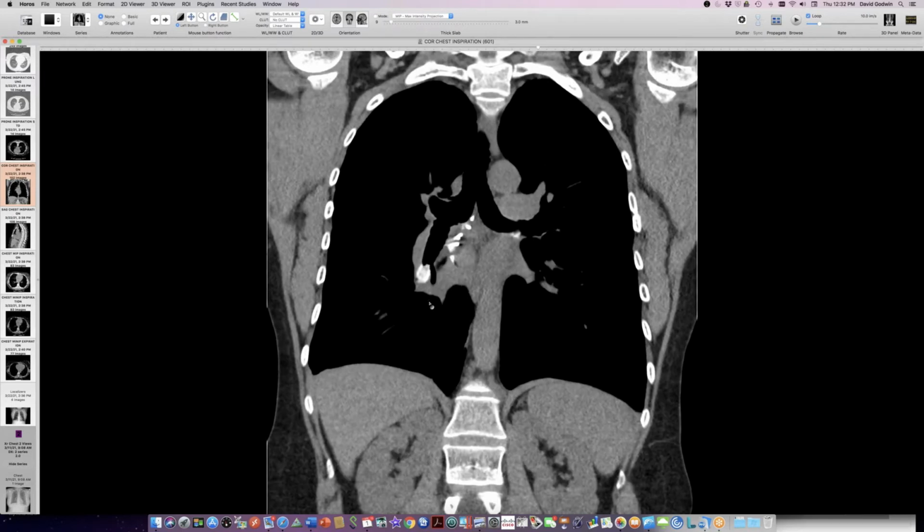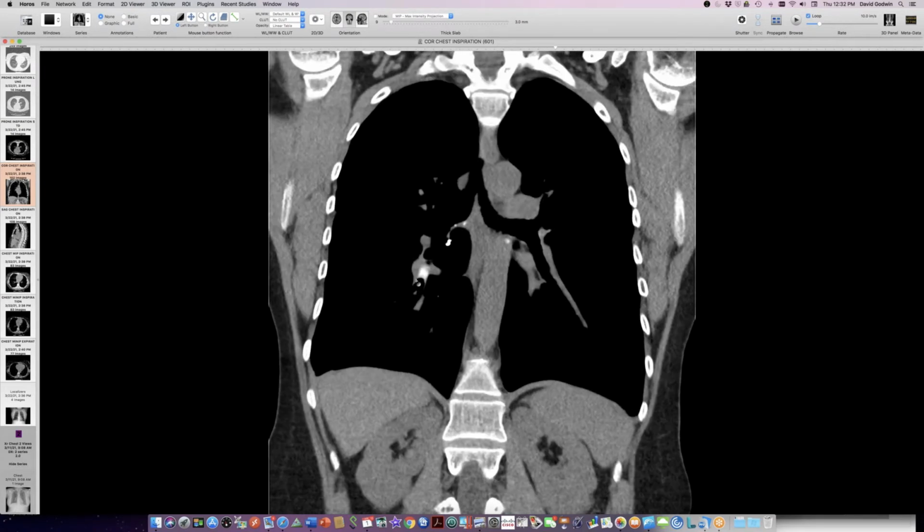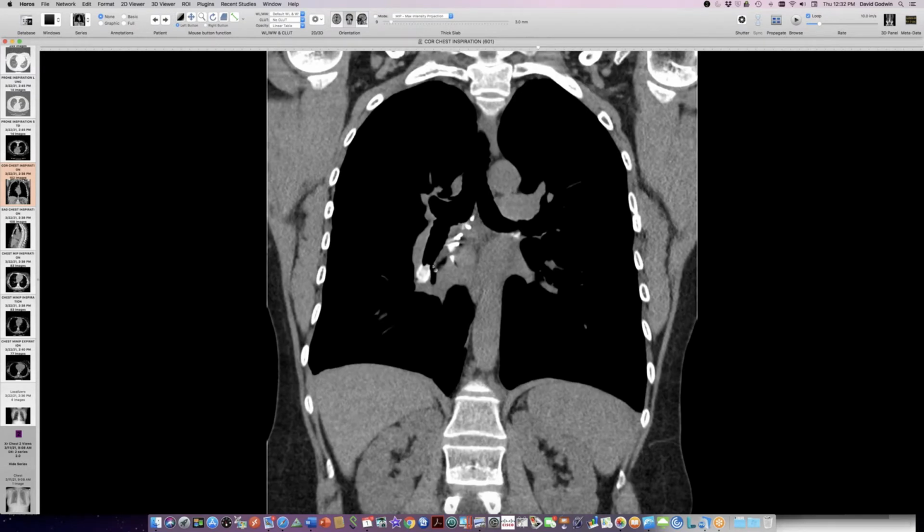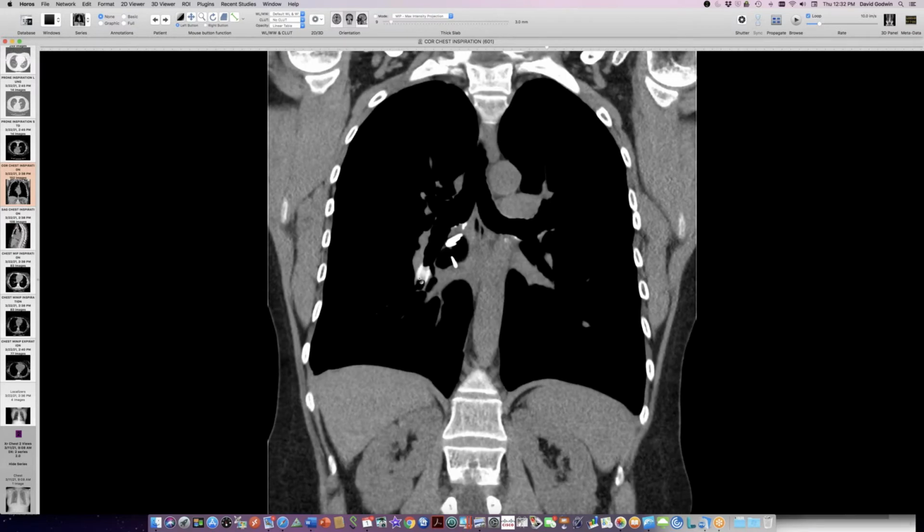So she takes calcium citrate, and she also takes a magnesium tablet. So it's thought that one of these tablets got aspirated, and we have this very bright object. She had been on iron, but iron was actually discontinued. That was in the past. And if this were really iron, it would be even denser than this, and the iron component would be in the center rather than on the edge. So I think that this is probably her calcium or maybe a magnesium tablet that got lodged here.